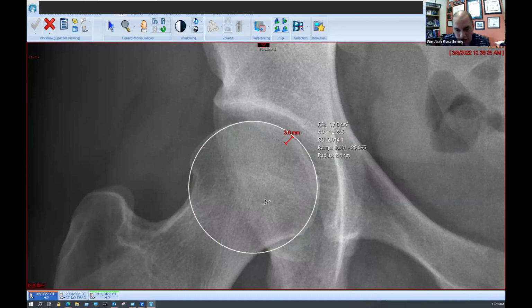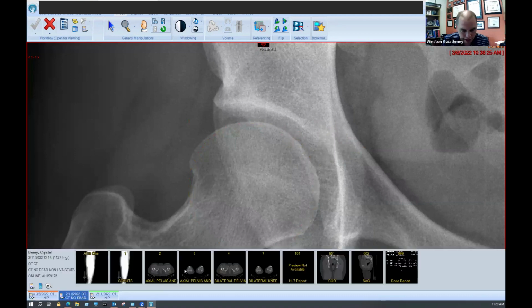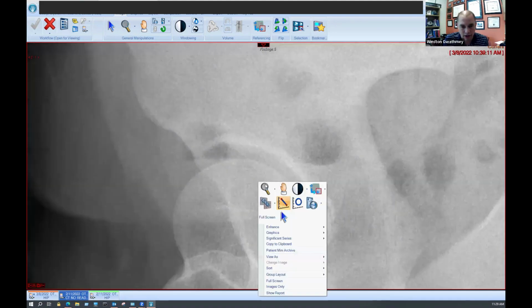And so you've got to be super careful with this if you're going to be looking to scope this hip. This is probably one that more warrants a PAO. And again, if this one actually got a nice CT scan and looking at femoral version, looking at some really different things here. So this was obviously worked up for a PAO.